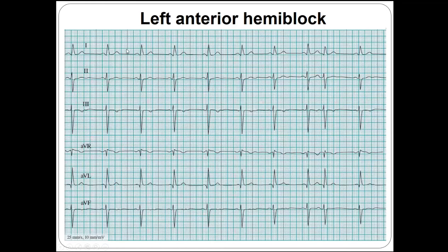Rhythmic, sinus, rate, 1, 2, 3, 4. It's about, let's see, for example, 65, good. P wave, yes. PR, normal. QRS, well, it's borderline, 0.1 second. Good. Axis, lead 1 positive, AVF negative, lead number 2 negative, extreme left deviation. So that's a left anterior hemiblock.